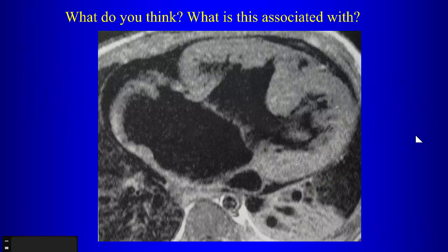Okay, what's wrong here? Yeah, so first we have a common atrium. What's the problem here? Yeah, what kind of VSD is that? Well, but it's near the inflow valve, right? There's nothing connecting it there. So this is an inlet VSD.